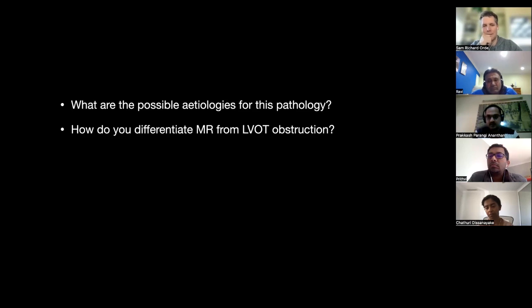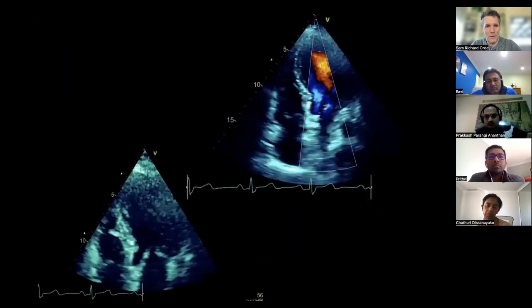Yeah, nice. HOCM. Very nice. And you could probably add, obviously not in this case, stress-induced cardiomyopathy as well, and right ventricle dilation with septal hypertrophy from hypertension. Yeah, good job.